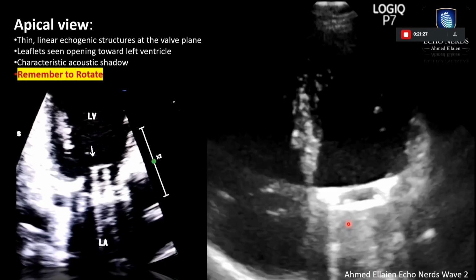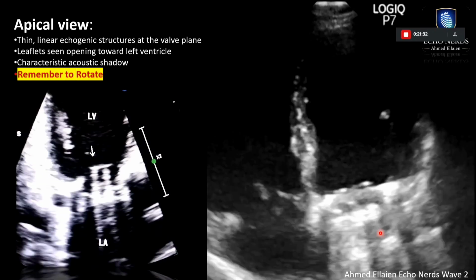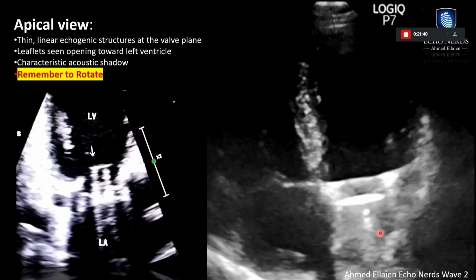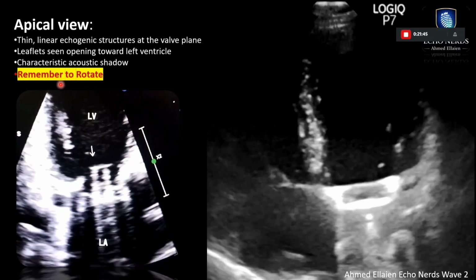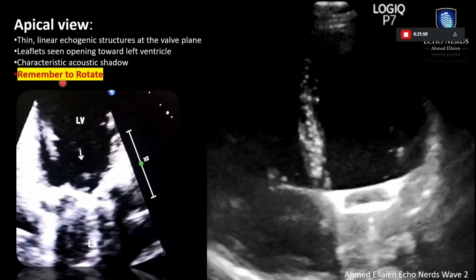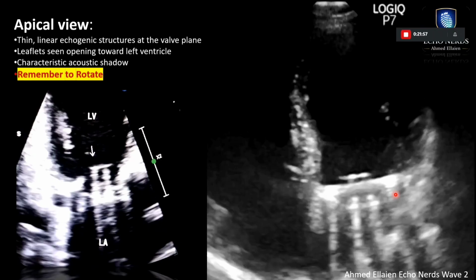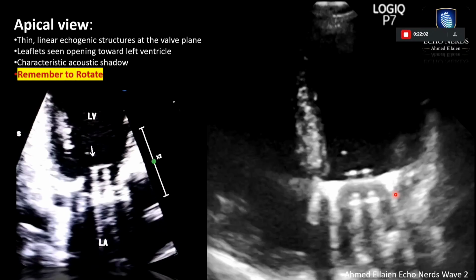Those shadows behind the valve are called acoustic shadowing, and we will talk about the artifacts of the valves in the next lecture about the normal physiological findings of prostheses. And a very important tip I added to this slide is that you have to remember to rotate. What's the meaning of this tip? This means that the mechanical prosthesis that is implanted does not have an optimum view, which means that I may get my optimum apical 4-chamber view, but I can only see one leaflet.